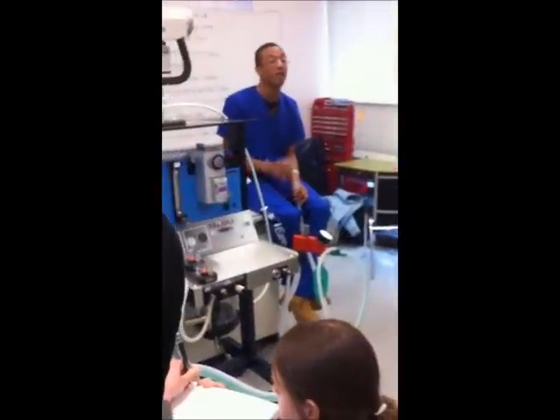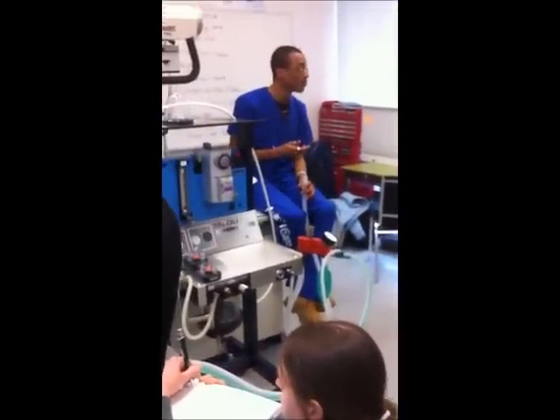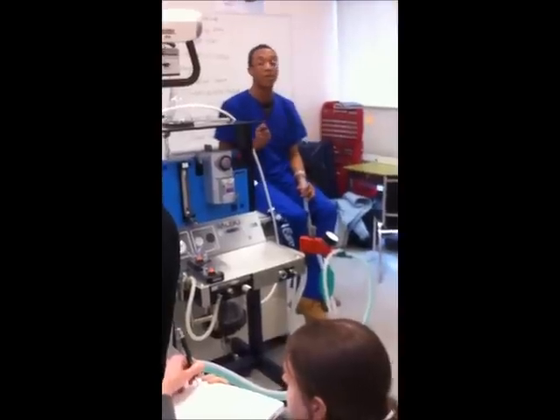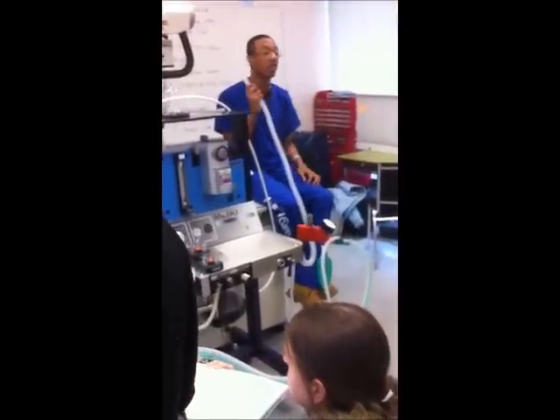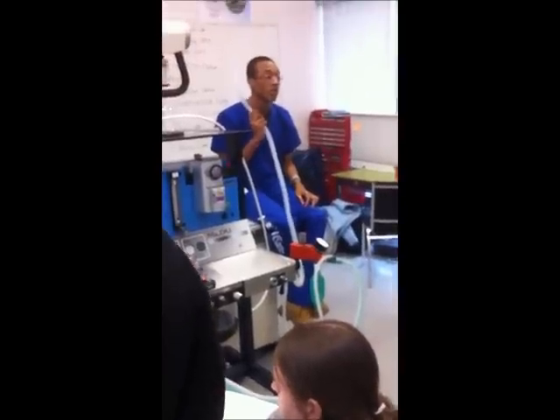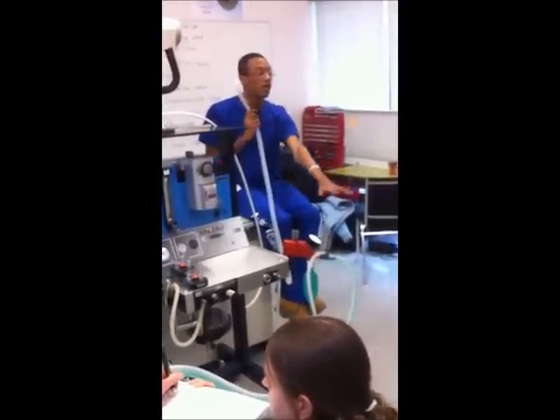What is the next thing we need to do? Pop-off valve. What do we need to do to the pop-off valve? Open it? Close it. If you close it, what happens? Cuts off the flow to anything leaving out the scavenger. So what happens to something hooked up to the circuitry here? Blocked.